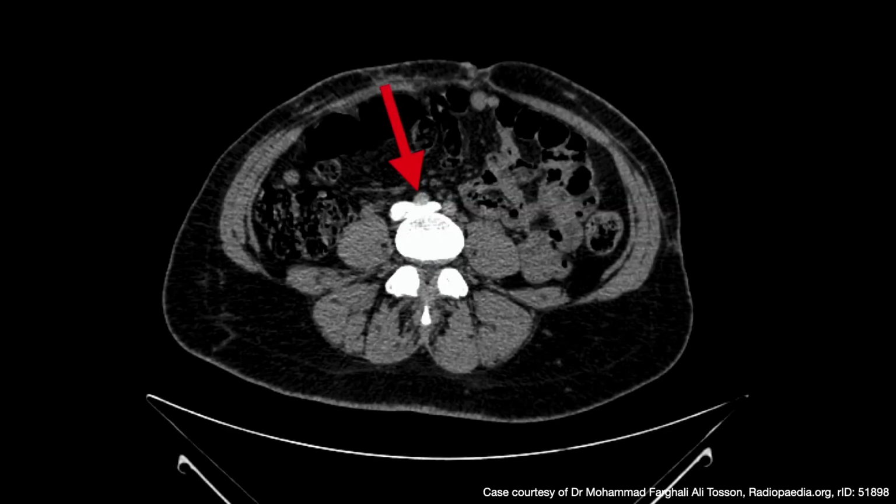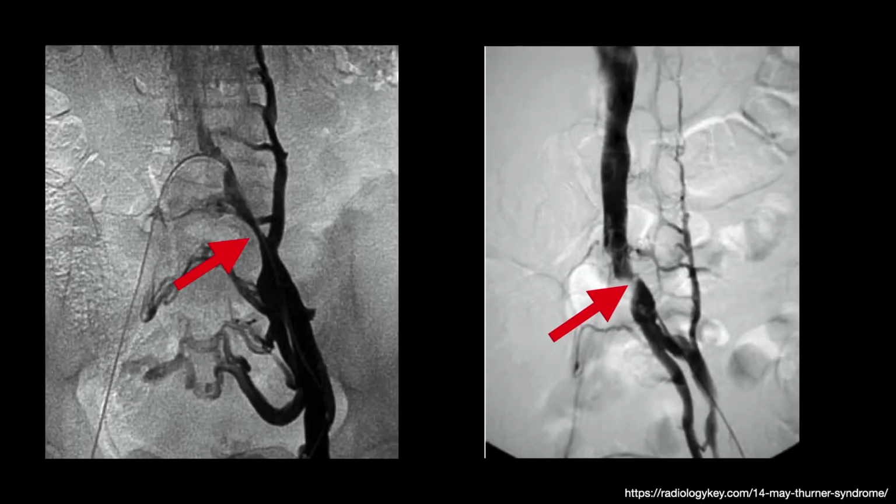And here's another example. This is actually a certain delayed contrast sequence where you can see the venous system is lit up with contrast, and you can see that artery compressing in on that vein, right? So CT or MRI cross-sectional imaging is a really great next step if you suspect this. That being said, we've got to round out the discussion with two other modalities that are of interest, more just to round it out, not necessarily because this is going to be the go-to thing that we choose in the emergency department.